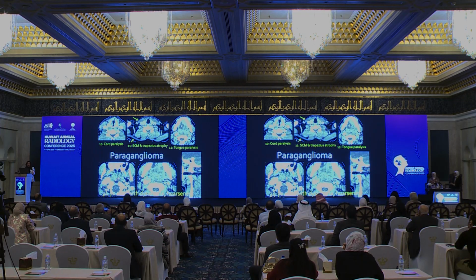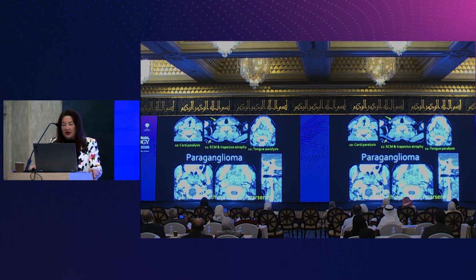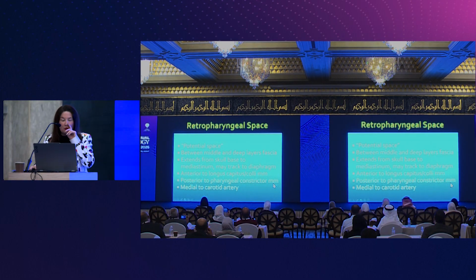And here is the classic paraganglioma. Here is a large vascular mass in the carotid space, displacing the internal carotid artery anteriorly, right? And you can see this is growing down directly into the jugular vein. Look how big this vein is. This vein is filled with neoplasm. And on the reconstructed image, this is dental artifact, but you can see the tumor in the vein, and here is the meniscus separating tumor from normal blood flow. So this is a paraganglioma.